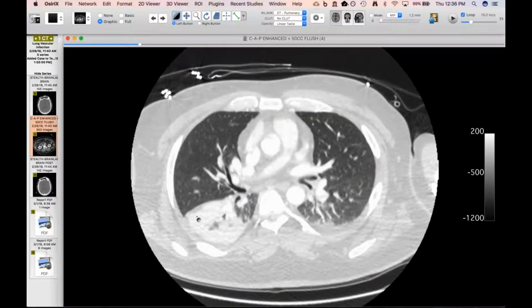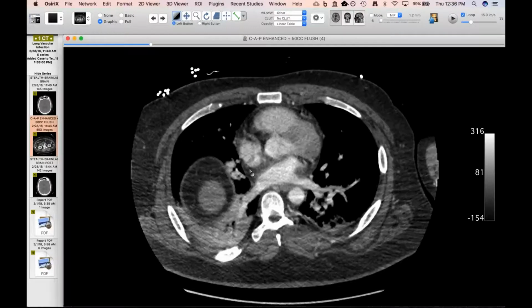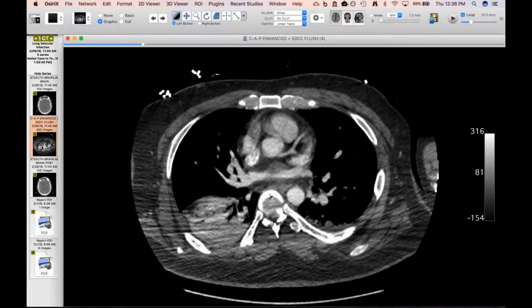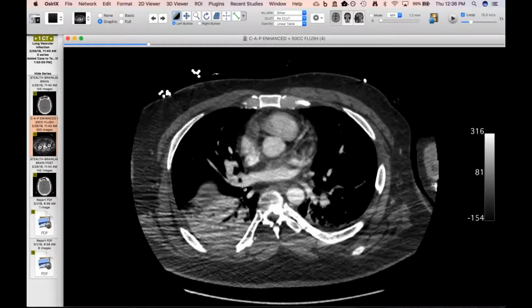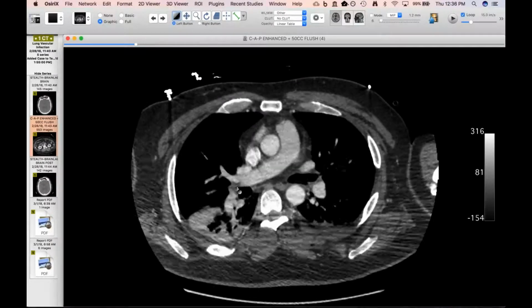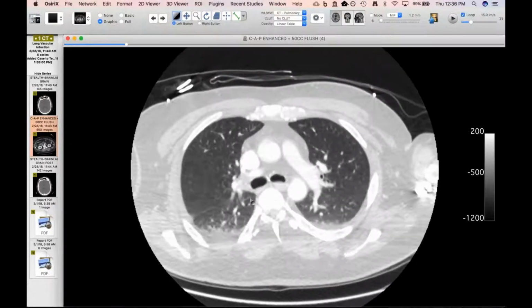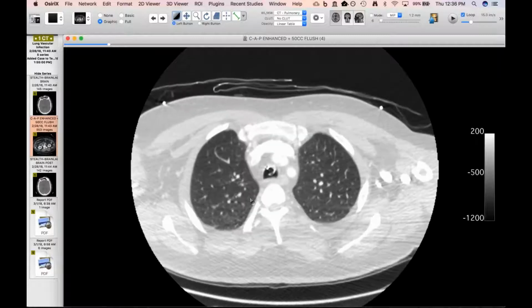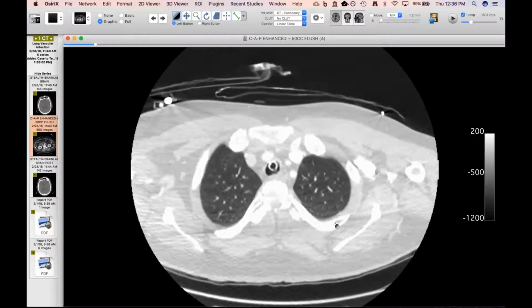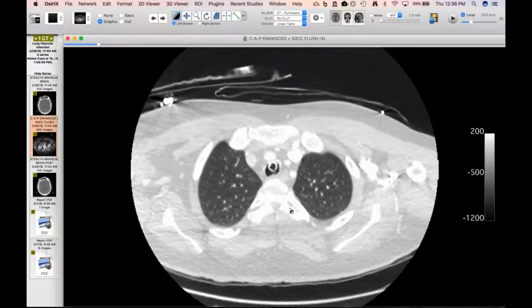And in the meantime, they did this study. He does not have a cancer, but of course, what he does have is this big arteriovenous malformation in his right middle lobe. I think you can see it drains into his right middle lobe pulmonary vein here, and it was arising from the right middle lobe artery right here. So no cancer, an unexpected finding there. He has a smaller arteriovenous malformation in his left upper lobe, and so of course that kind of seals the deal that this is going to be an abscess.